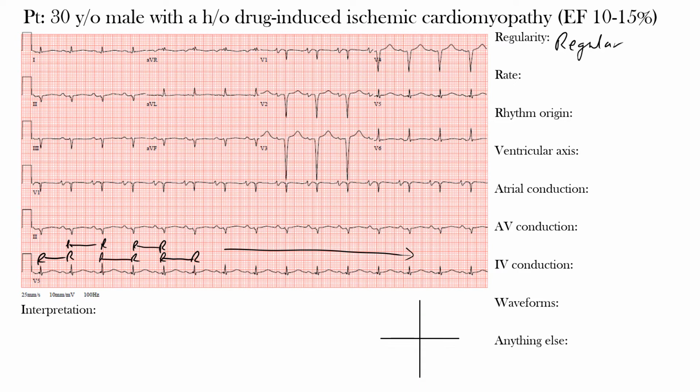So what did you get for the heart rate? Well, there's a couple ways we can do this because we're dealing with this regular rhythm. So one way is by knowing that the width or the duration of this EKG represents 10 seconds, meaning from the beginning all the way up until the end, this is 10 seconds. So if you multiply 10 seconds by 6, that gives you 60 seconds, which is 1 minute. Meaning that if we count the complexes going across, multiply that by 6, that can give us an estimate of the rate in beats per minute. So let's try that, okay?